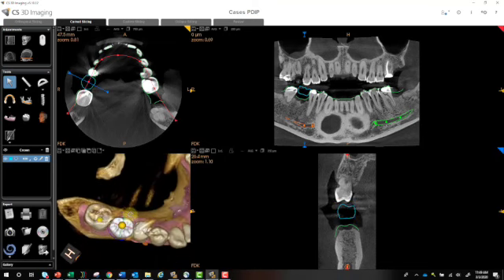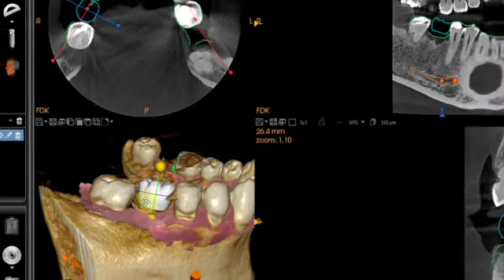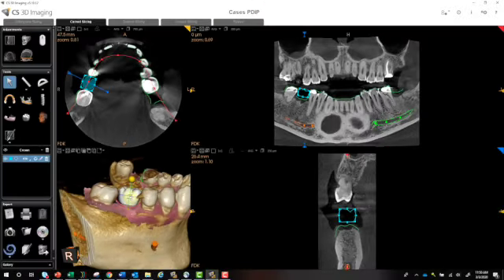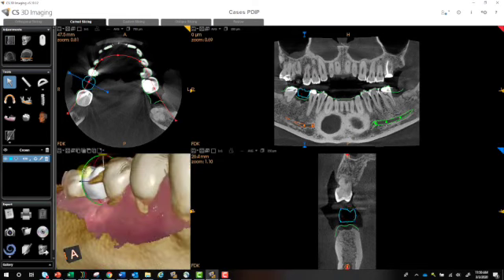And I can grab any of these little colored areas to center and turn. And when I have the 4 arrows on the crown, that's where I can actually move the whole crown, more of a bodily movement of the crown itself. When I see the 2 arrows in those directions, that means I'm attached to one of the little movement handles to turn it. So in this case, I'd be on the green, and I'm tilting it.